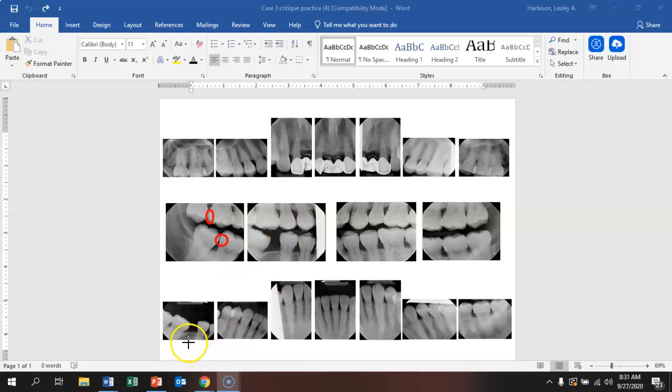The premolars are wide open here, distal of the canine here, premolars here again. This is less than 50%. Distal of the canine it's on a corner in both of these images. Let's just go with it is less than 50%, even though it's a little bit hard to say for sure, but let's just say that it is open.